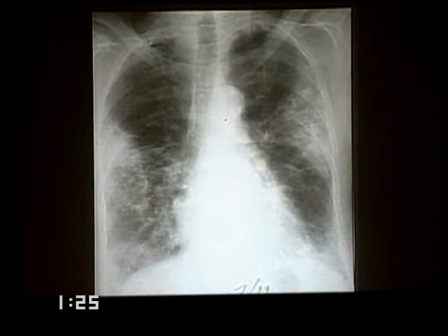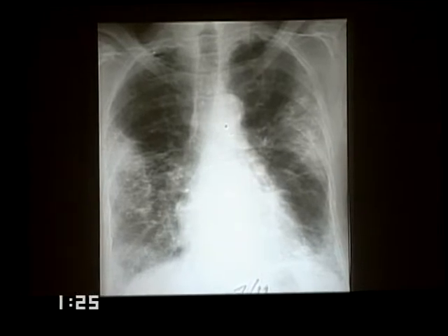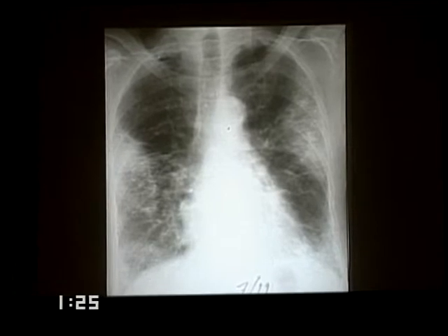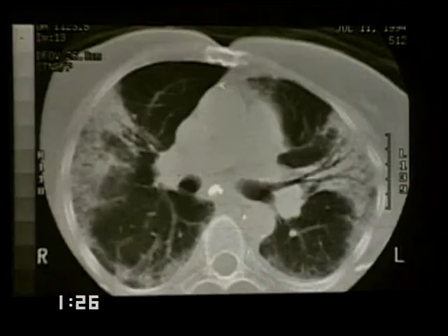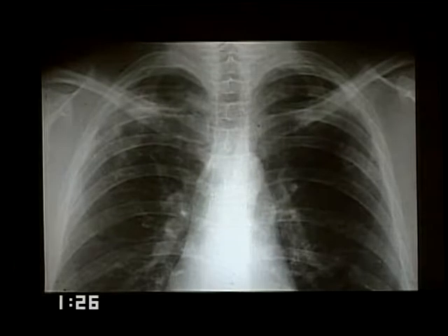A non-segmental distribution. This is a version of the BOOP, bronchiolitis obliterans, organizing pneumonia syndrome, which tends to be split off nowadays into cryptogenic organizing pneumonitis, or COP. It is classically peripheral, somewhat more commonly in lower than upper zone, and it is an airspace abnormality with traversing air bronchograms. Clinically, it can also, to a remarkable degree, simulate community-acquired pneumonias.